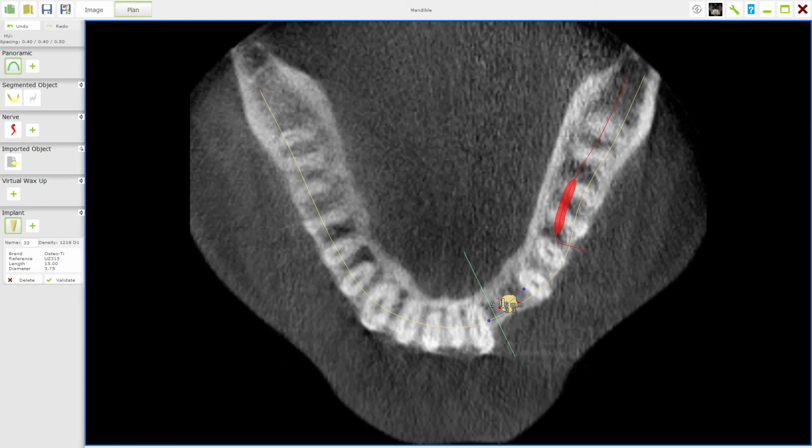We positioned our implant between the roots. There might be situations whereby you might want to position the implant a little bit closer to the 3, because if you want to make the crown of the 3 more in keeping with the crown, you're going to have spacing. And you have to decide, do I want spacing mesially and distally? Do I want to try and close up the spacing, or do I want to position the implant a little bit more mesially and have a little bit of space towards the distal? What is sometimes referred to as the anthropoid space, which is a space distal to your canines. So you could go for an anthropoid space, a little bit distal there, but you might decide I want to go in the middle and try and close that gap up.